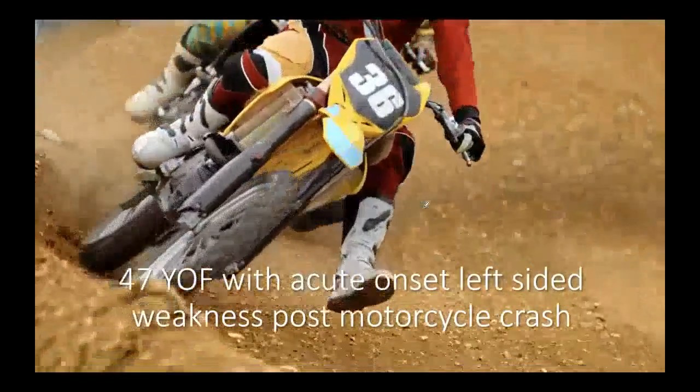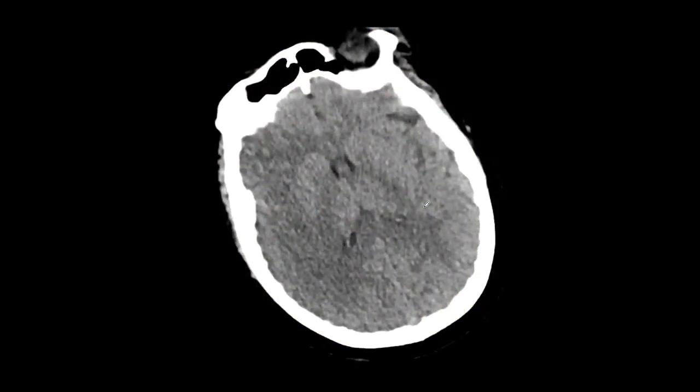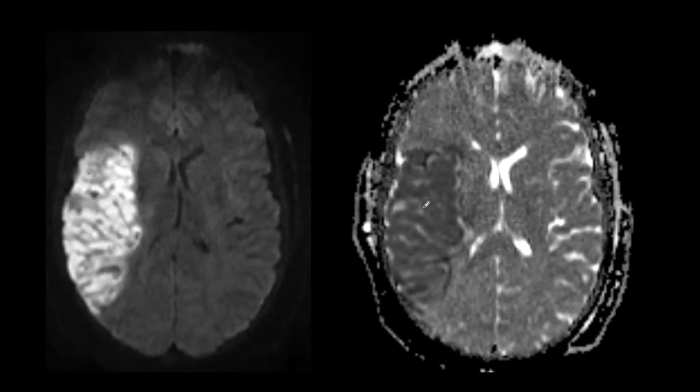This is a 47-year-old female with acute onset left-sided weakness post-motorcycle crash. Can anyone tell me if they are seeing something here? Loss of gray-white differentiation on the right side. Great. So it's in the right cerebral hemisphere, almost most of it that you're seeing here, but most of it is going to be in the temporal frontal lobes.